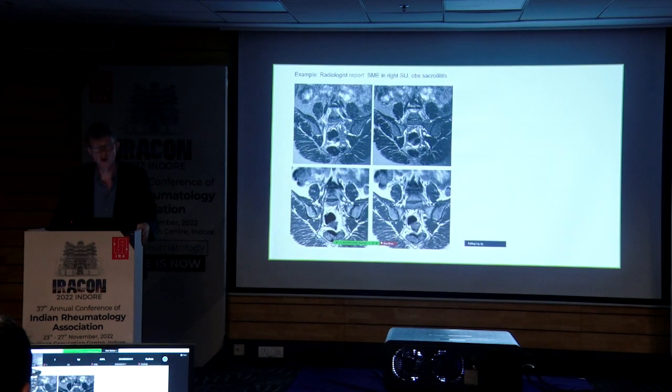Then you should, of course, always also think that the sacral joints are not the only part of the patient who is relevant. I think this doesn't really look like anything like a sacroiliitis, no matter how you put it, but still the radiologist wrote bone marrow edema in the right sacral joint of sacroiliitis. So that's what we sometimes get. And it was based on this area here, which is very mild bone marrow edema.